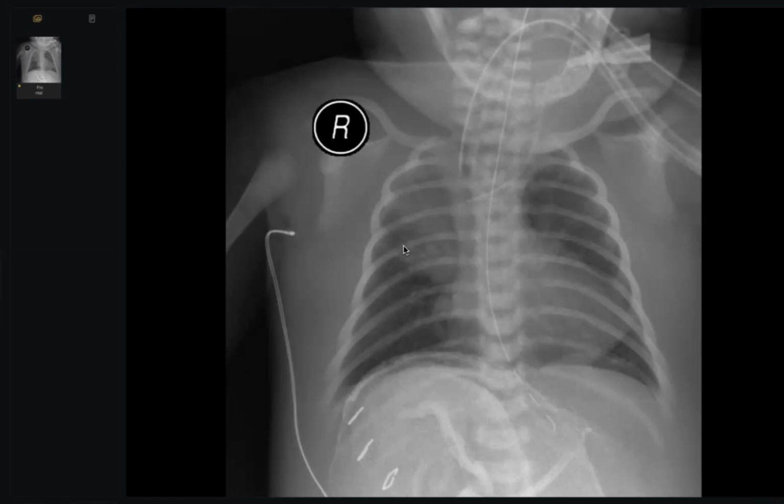Not patchy. It is better to say lobar or segmental, according to site. Lobar, larger than subsegmental, not patchy. It's a very common mistake in practice. The consolidation is homogeneous: lobar, segmental, subsegmental. If it is smaller, like a round nodule, or larger than a nodule, you can say patchy.